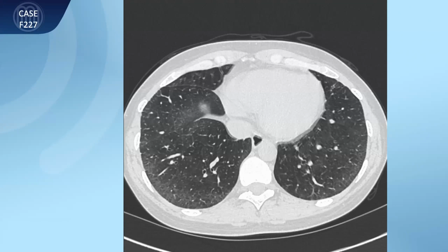So what we do, and I'm sure you do as well, when you first see a patient with a fibrosing lung disease, they get immunosuppressive therapy, and if it works, it works. But in most cases you don't see much of a striking effect on ground glass. It's usually a very fine reticulation, fine fibrosis, with the low resolution of CT scan, so you can't discriminate that.